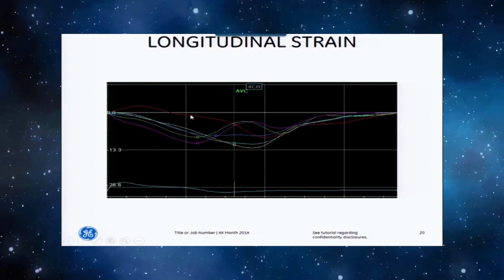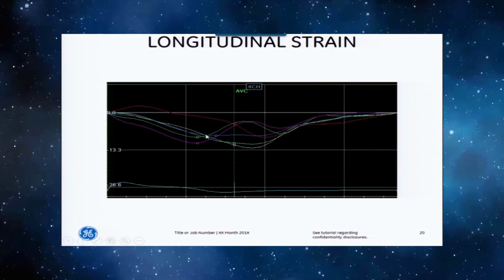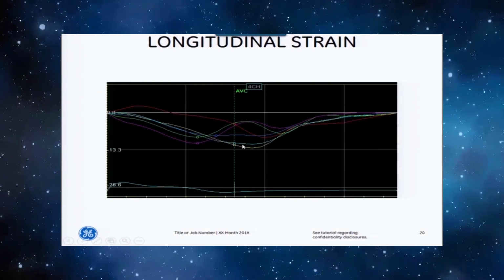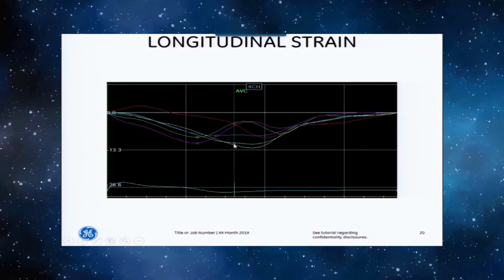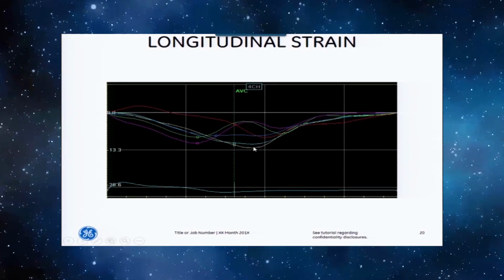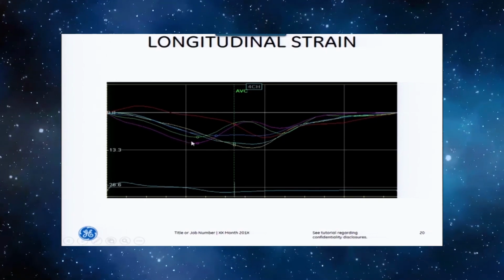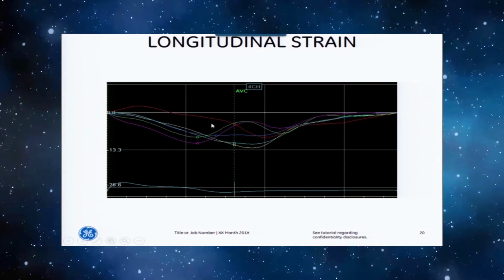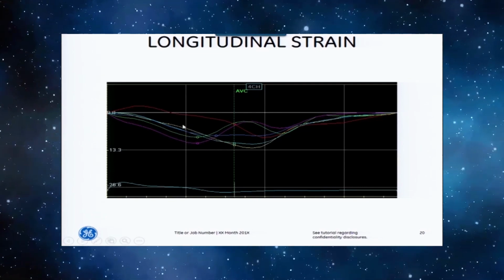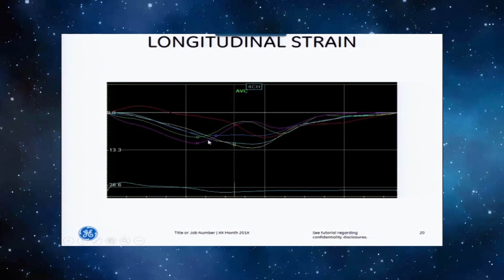However, when we look at this graph, we can see that this set of curves comes down like this, and many of these graphs don't hit their peak till well after the aortic valve closes, right? But now we have another set of curves that are coming down like this, going up, and you can see where these curves actually cross each other in systole, creating an X here. That is an indication of dyssynchrony.